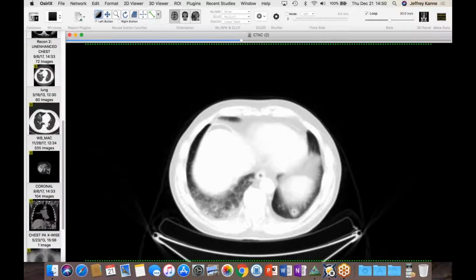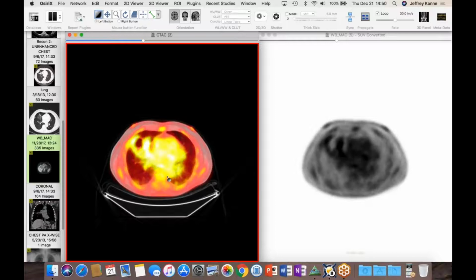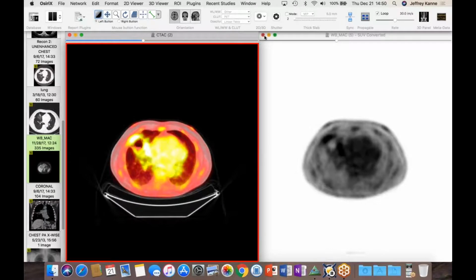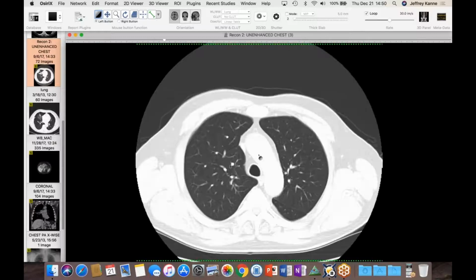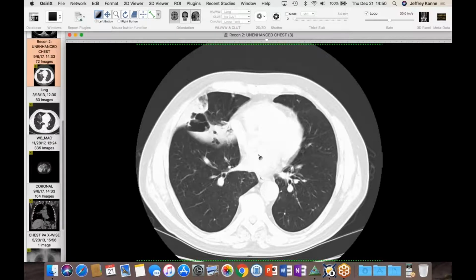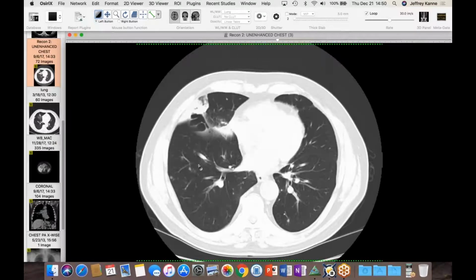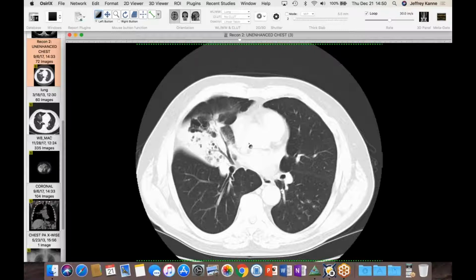So then I'll fuse the PET here and just show you how much activity is in this. It's probably not windowed exactly right, but this is another mucinous adenocarcinoma. And this is that endobronchial or aerogenous spread of tumor that, it's funny, I think we all recognized, probably dating back to early practice or training, we saw these adenocarcinomas that involved both lungs, yet there was no mediastinal disease.